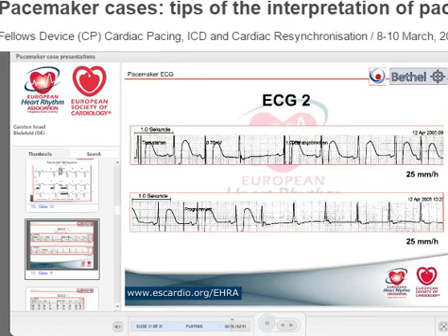So obviously the atrial pace is sensed by the ventricle. And this is obviously quite life-threatening. And here you see, in fact, atrial pacing an A, and at the same time, ventricular sensing an R. So that is the proof. This is ventricular crosstalk. The atrial pace is sensed in the ventricle, and this could, of course, lead to death.